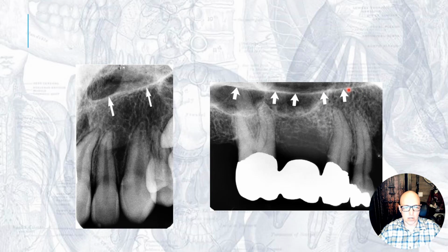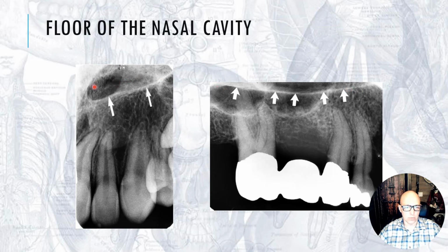So both of these I would just call the nasal cavity. This one is still kind of the anterior opening, or the aperture, of the nasal cavity. And this is more descending posteriorly, or extending posteriorly. You could also call this the hard palate line, because those are like two sides of the same coin. You've got your hard palate or your nasal cavity.